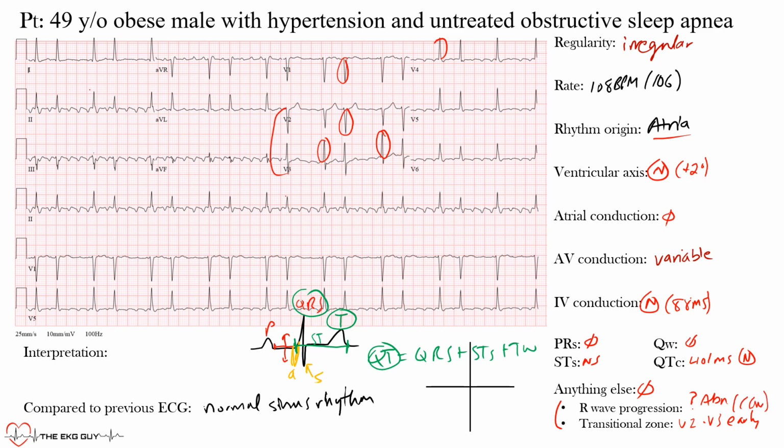And because of that early transition, just like R wave progression, again, all lead placement dependent, that early transition may suggest that there may be some infarct there or something going on in that region there on the septal portion. So an early transition there, but I would be hesitant to say that there's much more going on in that region without that, okay? And even potentially repeating that region may be helpful if clinically relevant, but I don't think it would be indicated.